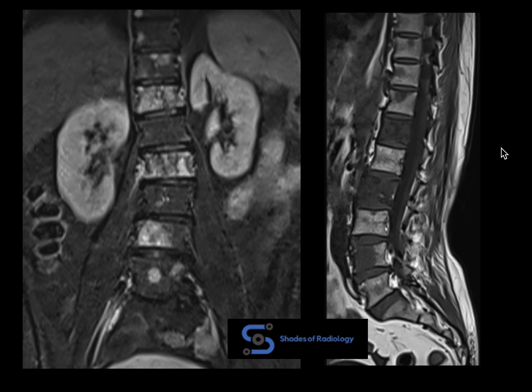Another classic, elderly patients, multiple lesions in the spine. Yes, it could be. First possibility should be metastasis. You can see multiple variable lesions. You can see variable size lesions. You can see the altered marrow signal intensities of all vertebrae. You can see multiple hypointense lesions on T1 as well. So this is a case of metastasis, but the differentials include the lymphoma and multiple myeloma.